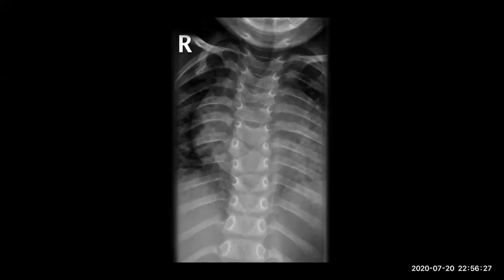A frontal chest X-ray of a skeletally immature patient. Or dorsal spine. This is a frontal view of a dorsal spine X-ray. Okay, what do you see?